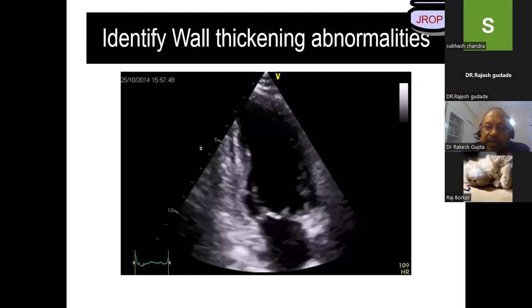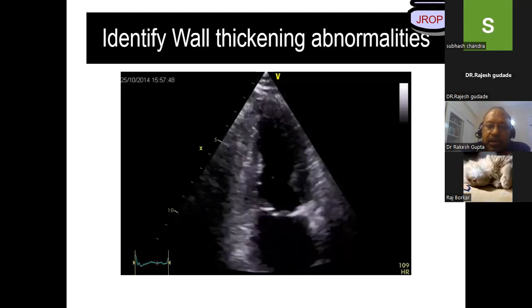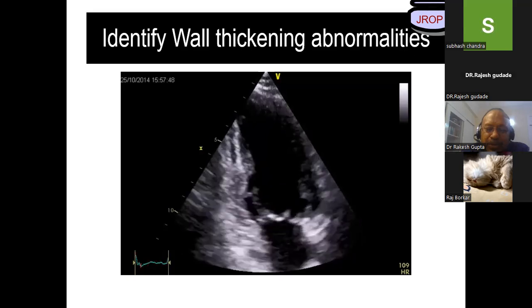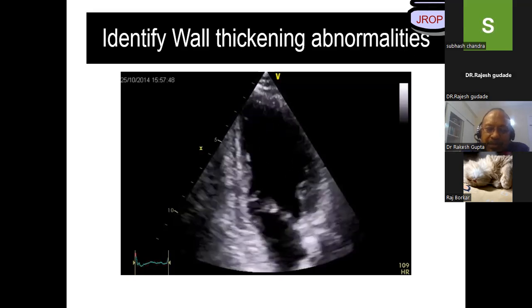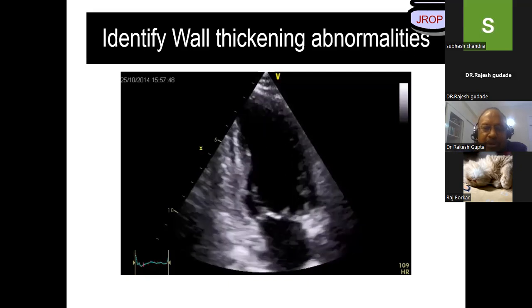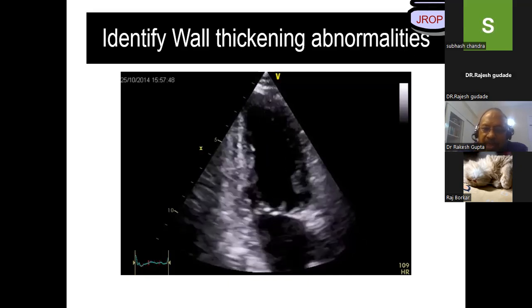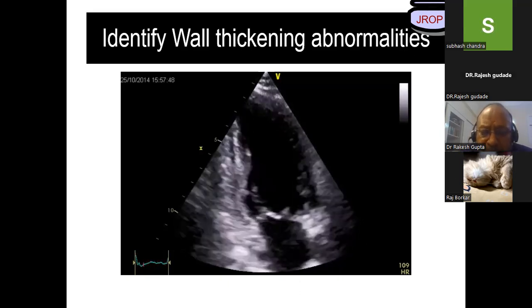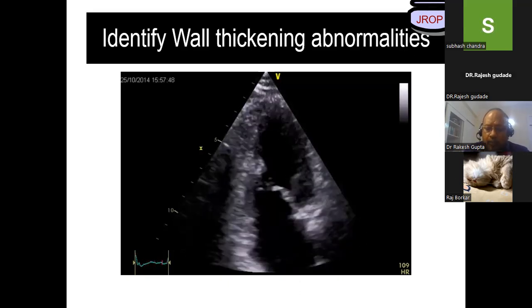Tell me whether this patient has got anterior MI or not. Could be, sir, the heart rate is fast. Heart rate has nothing to do with the acute anterior MI. If I have a bradycardia, does it mean that I've got no MI? No, sir. Then? So yes, possible. Patient presents with acute LBBB.